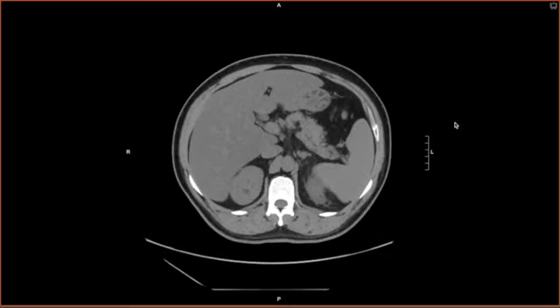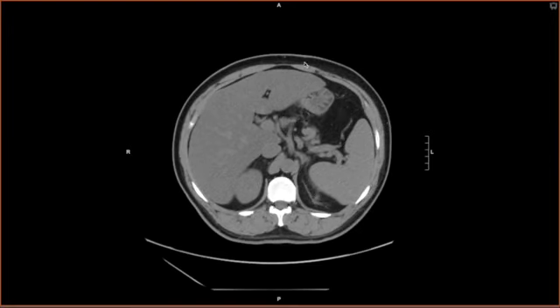Okay, so now let's move back to talking about the basic radiographic densities, Hounsfield units, and then we'll talk about some clinically important applications of Hounsfield units. So this is a CT abdomen without contrast, where we can actually see all the basic radiographic densities. So we have fat out here, that's darker. We have air out here, that's even darker. We have soft tissues in the spleen, in the liver, in these muscles along the abdominal wall. We have bone here as well.